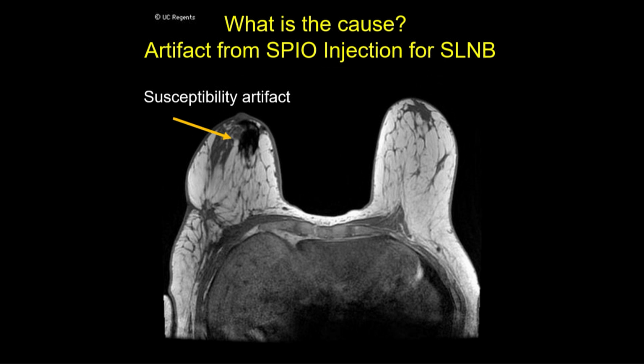So this is actually in the literature now. We did write this up, and it's a pitfall. It's something to watch out for. So we only do this now in patients who are going to have a mastectomy. If they're going to have breast conservation, we have a different method of injecting. So we complained about this, and now all that did was buy us more work.